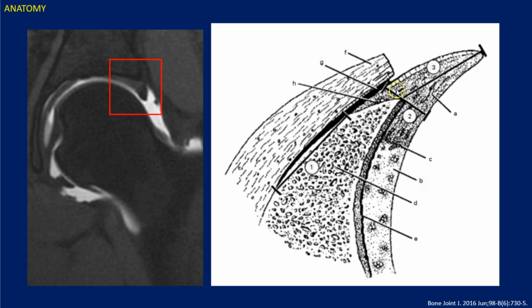Number 3 here is the fibrocartilaginous labrum itself, demarcated by A, 3, and 2. 3 shows you the mediolateral dimension, and 2 shows you the width of the labrum here. So all of this triangular structure is the acetabular labrum itself. Again, it's fibrocartilage. Now note here this sort of divergence of the labrum at the rest of the acetabulum.